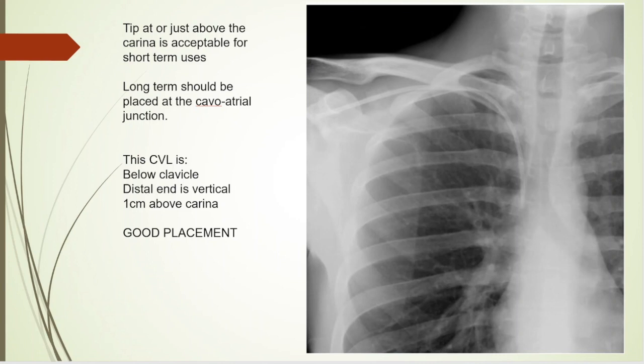So anyway, here is a film. Looks like they're doing a line placement, and we'll start off by tracing the trachea, A for airway, down where it bifurcates right and left bronchus. There's your carina.